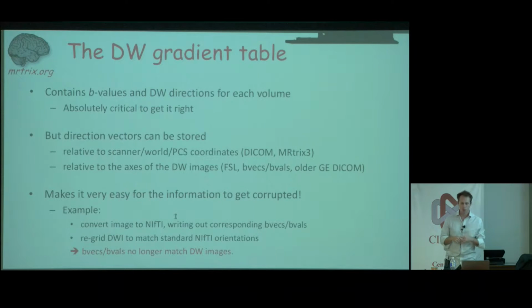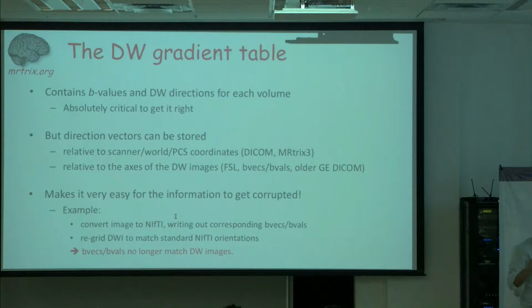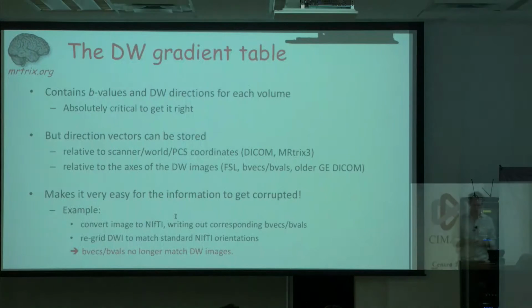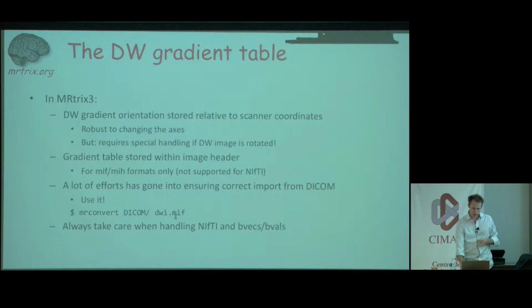all these things. One thing you can do is acquire some test data with a really strong angulation and then no angulation and verify that actually the directions that you get are correct, because it's so easy for things to go very badly wrong. So there we go. I think I've said it. The point here is a lot of effort has gone into ensuring correct import from DICOM. Use it.